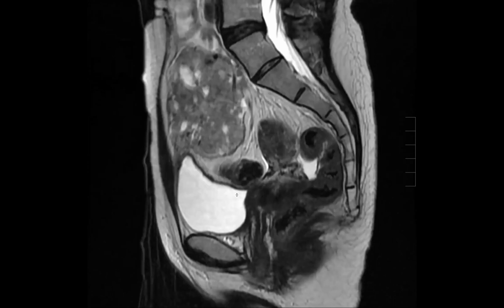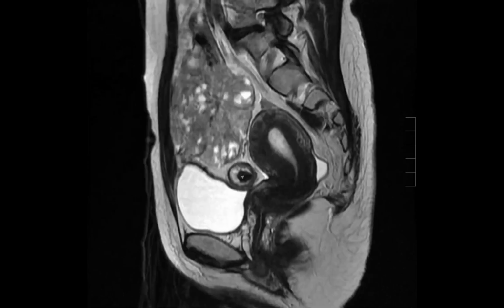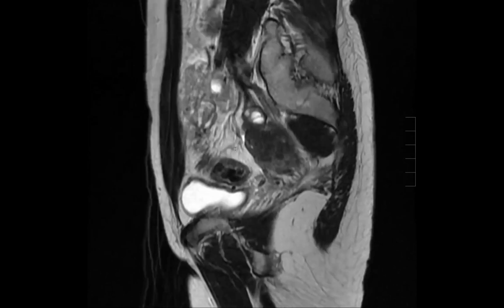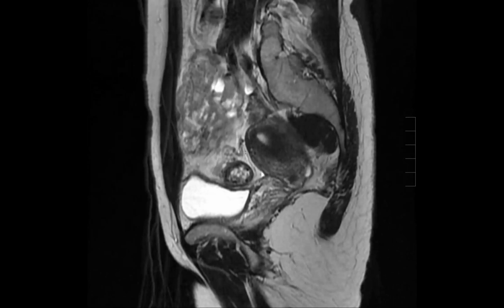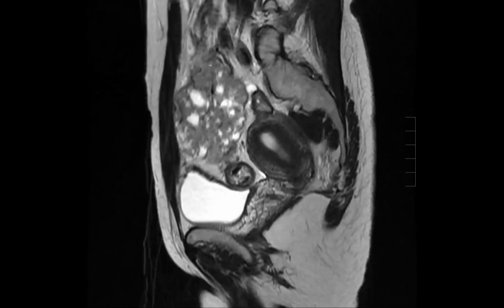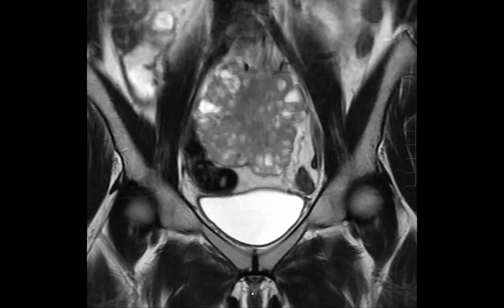And then wait, I think I see some kind of stalk with something at the superior margin of the mass, I feel like. Right there. No, it's just vessels, like these little flow voids. No, at the superior margin of the mass. Yeah, superior. There are vessels going into it. I see no small bowel loop that it's connected to. Here, let me see if this shows it better.